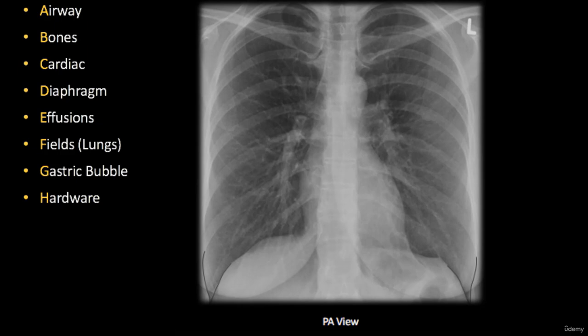Sometimes we can see a level of fluid in this costodiaphragmatic recess, and we call it effusion because we don't know what exactly this fluid is. We then take the next step and aspirate some fluid out for biochemical examination to make the precise diagnosis and to figure out whether it is blood or pus or lymph or just interstitial fluid. So normally the angles are empty.